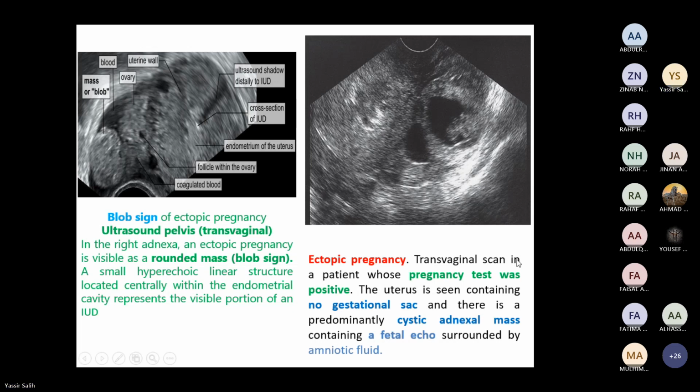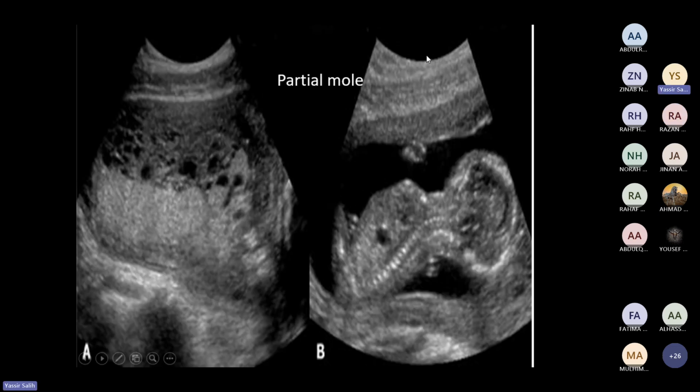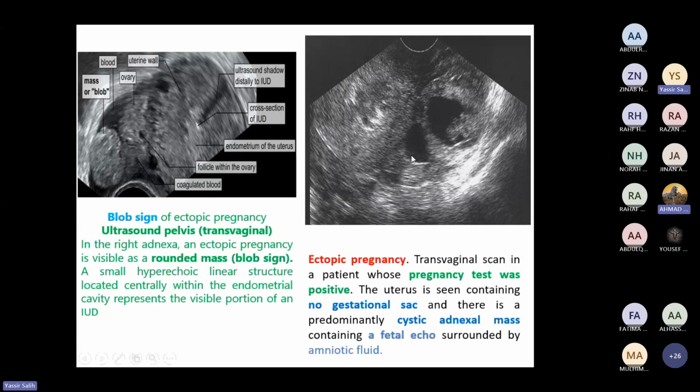What do you see؟ Gestational sac. طبعا هي الصورة ما واضحة. اول شيء this is the uterus and to be oriented this is the uterus زي كده ده اليوترس. Okay. No, the gestational sac. Yes, the uterus is empty. يعني اليوترس هو بلكي وما فيه شنو ما الجستيشن الساك او في cystic lesion in the adnexa.